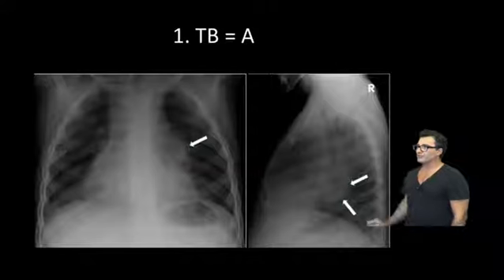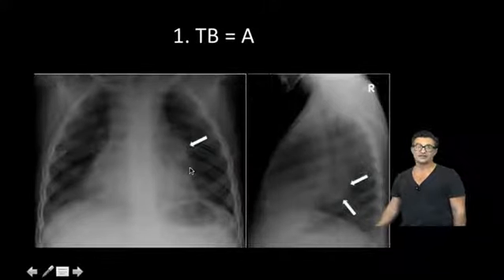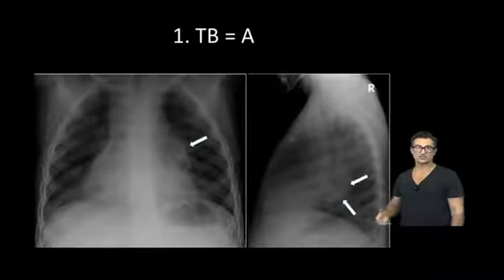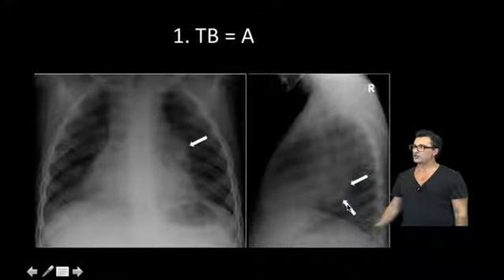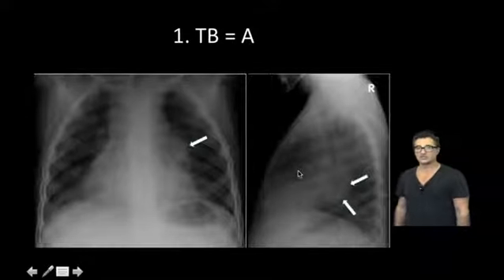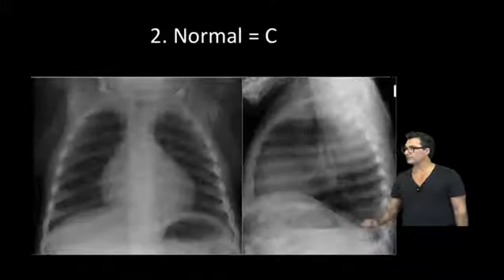I chose this answer because the left hilum, as you can see here where the arrow is, is not an open V. It contains structures within it, a soft tissue density. And if you're not convinced, you can look on the lateral X-ray where there's almost a complete donut. And of course, I use the arrows on the structures at the bottom half of the donut because those represent the lymph nodes. So just on the presence of lymphadenopathy, we would call this tuberculosis.